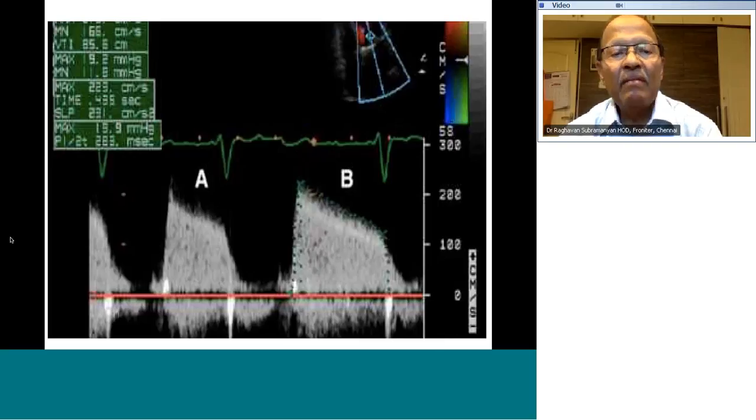It is not pulse wave Doppler. Somebody said pulse wave Doppler. It is continuous wave Doppler because the velocities are fairly high, close to 2.5 meters per second, and therefore it's a continuous wave Doppler spectral recording from the apical window across the mitral valve. Now that's the way to describe it. Okay.